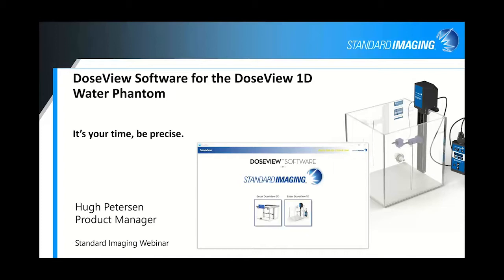Quite honestly, it's a great leap if you've ever used our pre-existing 1D software. It's definitely much more user friendly and intuitive compared to the old system, and has a lot more functionality.